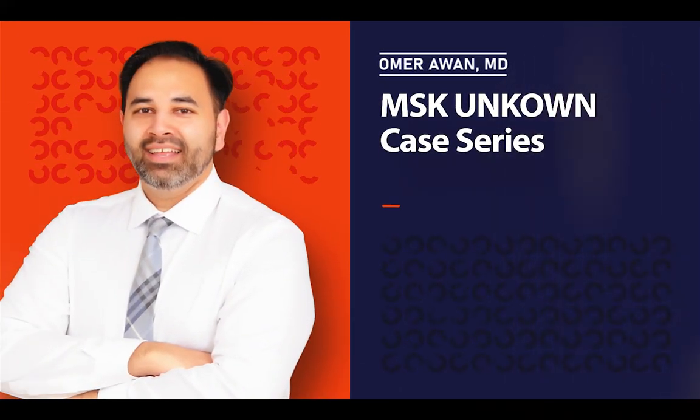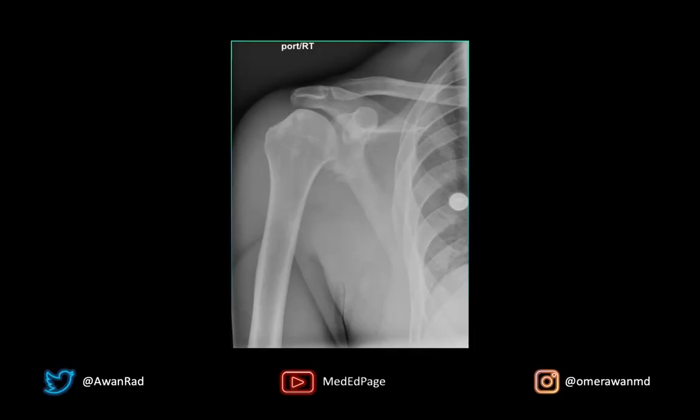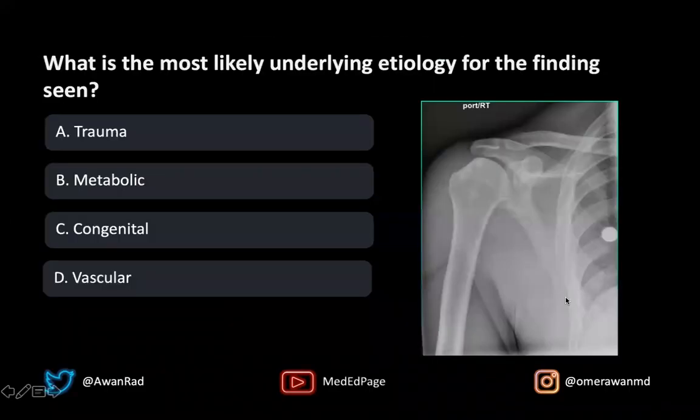Hello and welcome to MSK Unknown Case 85. Here we have a frontal view of the shoulder. And the high yield question is, what is the most likely underlying etiology for the finding seen? Is it trauma, metabolic, congenital, or vascular? What's the most likely underlying etiology for the finding seen?